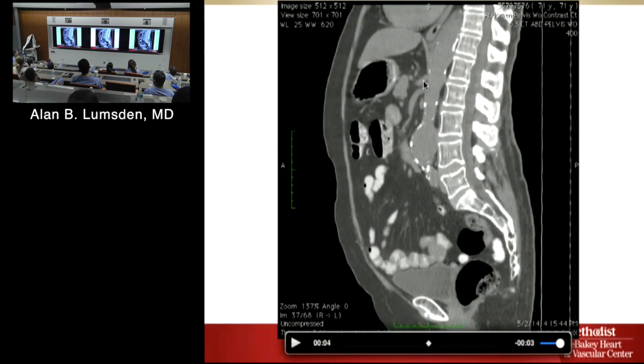So, aorta, what's that? Celiac trunk. Celiac trunk, there's that diaphragm thing we were talking about, remember? It pinches right on the top of the diaphragm. What's that? SMA. So, what's that probably? Renal vein. That's probably the renal vein crossing the midline, just looking at it in a different view. Let's see what else we can see here that's of relevance to us.